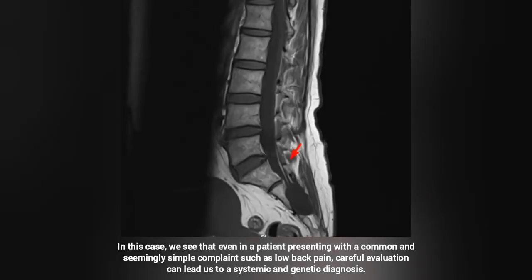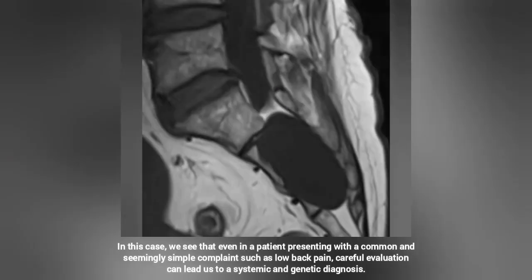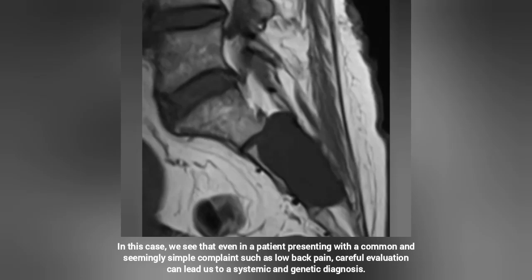On the same T1 sagittal image, I also notice a thin linear hyperintense signal area in the sacral region. This appearance may be consistent with a filum terminale lipoma. Its hyperintensity on T1 suggests fat content.